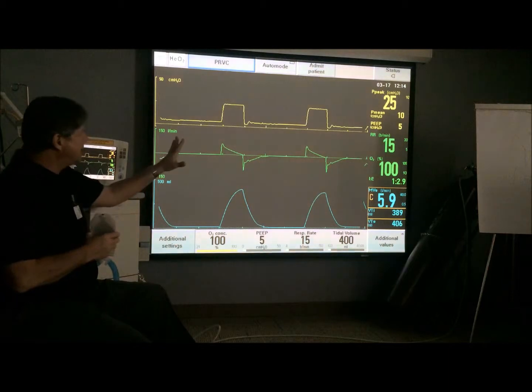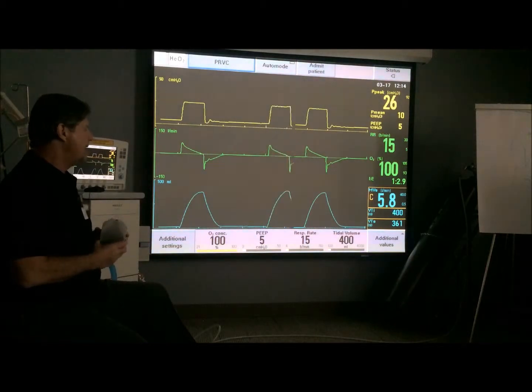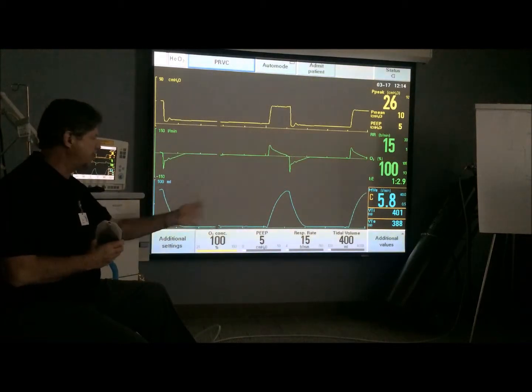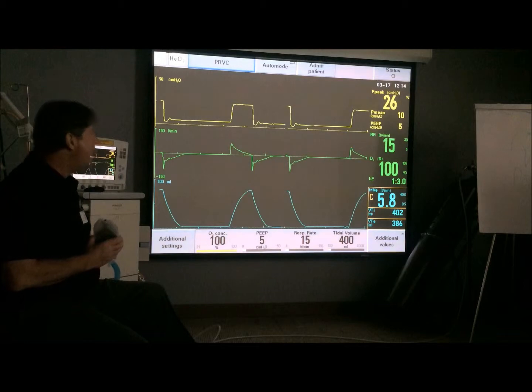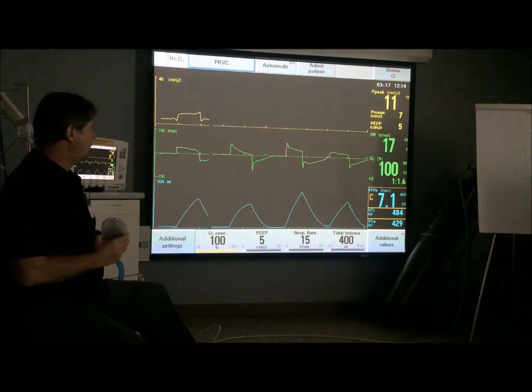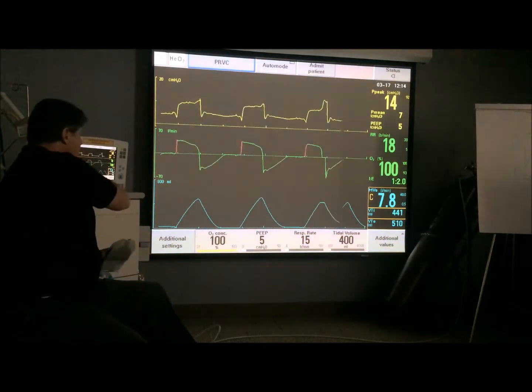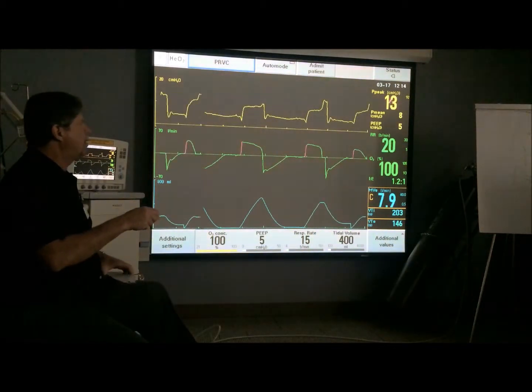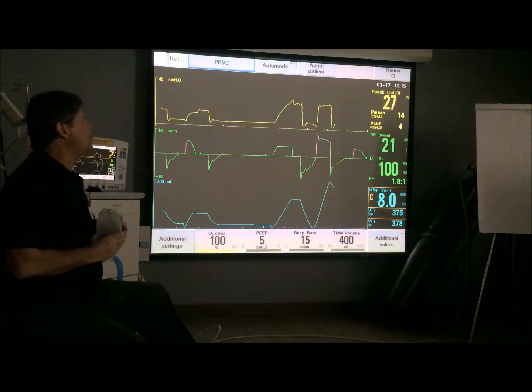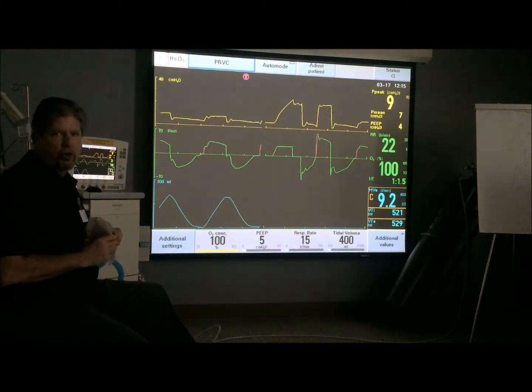Because if you set me up originally and I'm somewhat sedated and I'm getting the volume that I want, but now I begin to come out of sedation, and this is a low tidal volume for me, let's say, that I would be more comfortable at 600, but because of your low tidal volume strategy, you want to maintain 400, I begin to wake up and now I'm pulling because I'm somewhat air hungry. So as I pull, notice I'm trying to get more volume, and the ventilator initially delivers more volume, but because it says I'm delivering this greater volume, I have to now lower the pressure because I want to target this volume. So what happens is, at a time where I'm really wanting more support from the ventilator, the ventilator is actually withdrawing support from me.